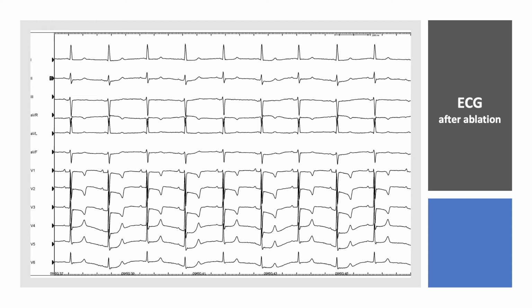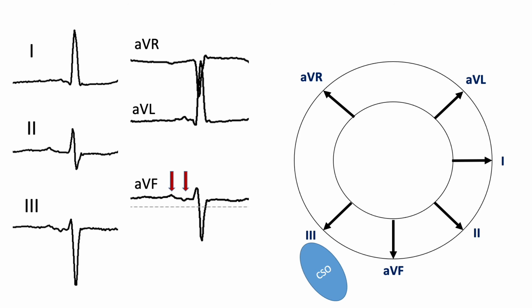During sinus rhythm, with this example, I would like to discuss with you the application of the P-wave morphology to find out the interatrial conduction disturbances and also the pattern of interatrial conduction. So let's take a closer look at the P-wave morphology in limb leads. In limb leads, especially in aVF, we see clear distance between right atrial and left atrial P-wave and activation. So we have an interatrial conduction delay.